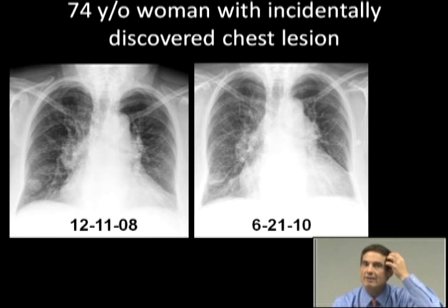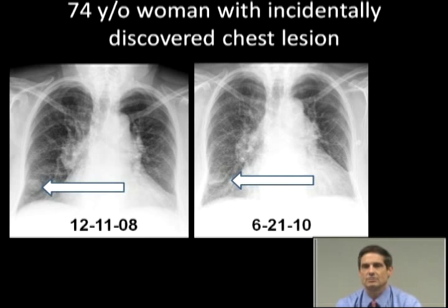As fortune would have it, between the first time I found and diagnosed this case, and the first time I gave this lecture some almost 2 years later, this patient had some trauma to her chest wall and came in for a chest x-ray in the ER. It's like the day before I gave the lecture, and she had another follow-up chest x-ray, and the lesion looked just the same, so it's stable through time. Again, indicating that it's a benign lesion.